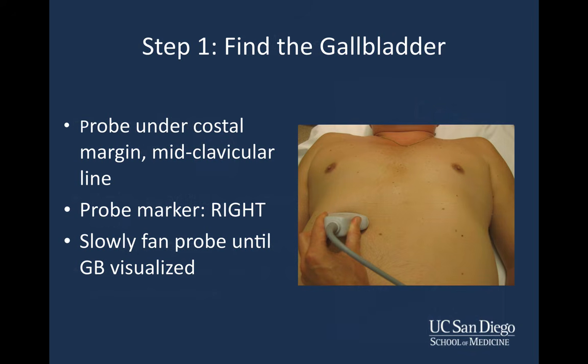Now, in terms of doing this exam, the first thing we're going to want to do is find the gallbladder. There are many different ways to do this, and I'm not proposing that the steps we are going to discuss in the next few slides are the only way, but this is the way I do it, and I have had reasonably good success. So I propose, if nothing else, this is a starting point, and you can modify this technique as you obtain some additional experience at the bedside.